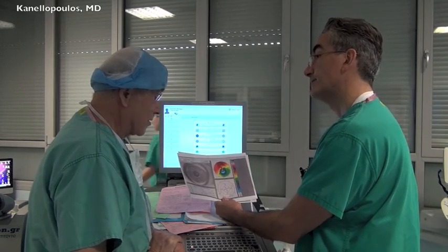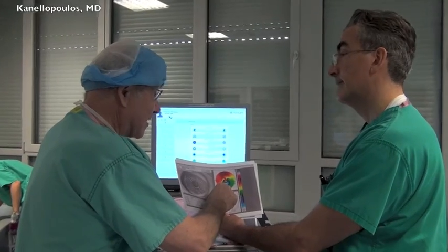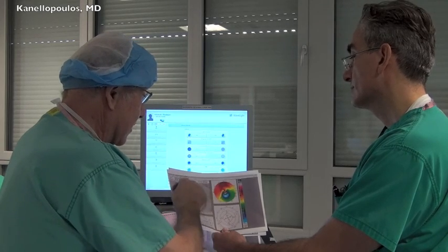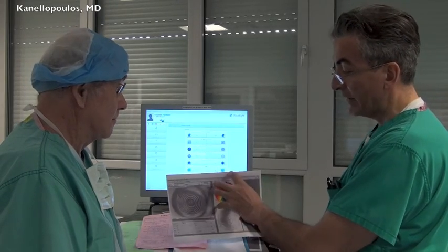And that's a good example of where the color-coded interpolation can maybe lead you astray a little bit, because we don't really know what it's like underneath the eyelid here. And that's an excellent point also as well in pentacams, because we see pentacam maps.